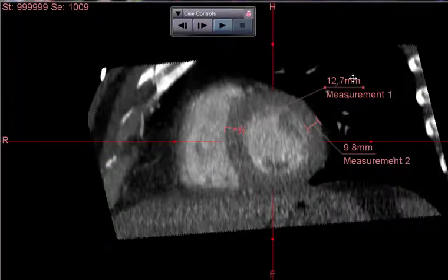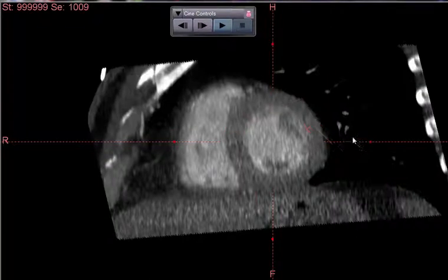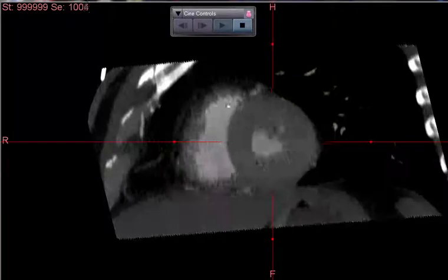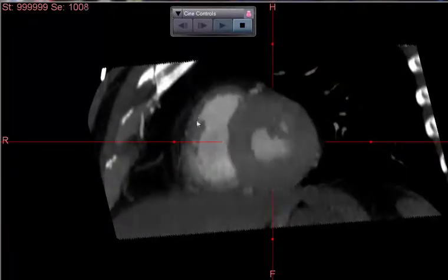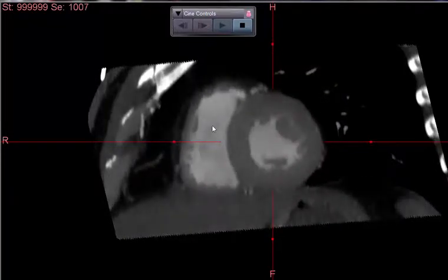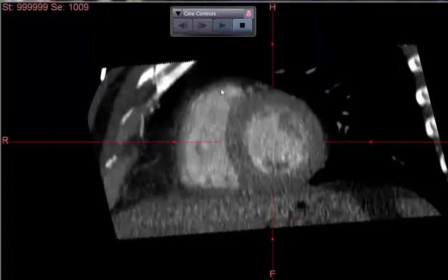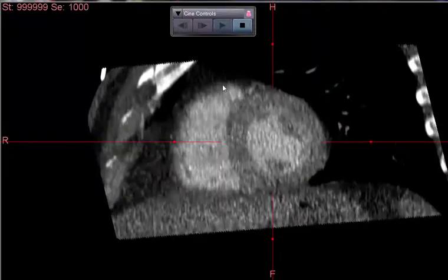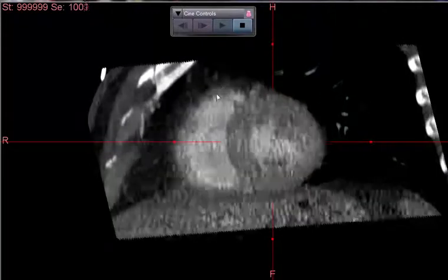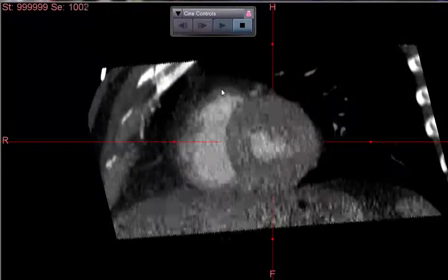Let's just for a second remove these two areas. Let's also now look at the right ventricular function, and I'm going to hit the cine button here. Now, there are some issues here that can be seen in the right ventricle. If we look at this in the short axis, it's clearly not dilated. It appears to have very normal function, but you get the idea that there is some right ventricular hypertrophy. This should be normally quite paper thin. So we have some element of right ventricular hypertrophy. We clearly have left ventricular hypertrophy.